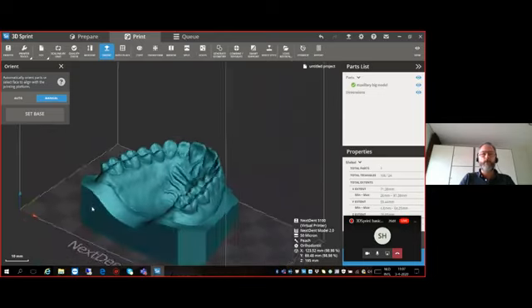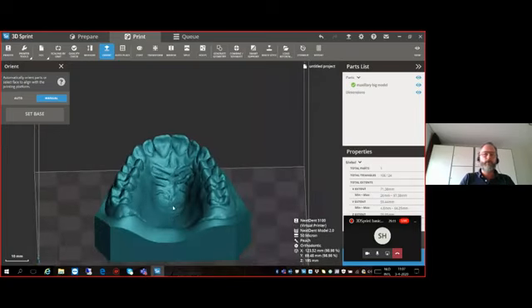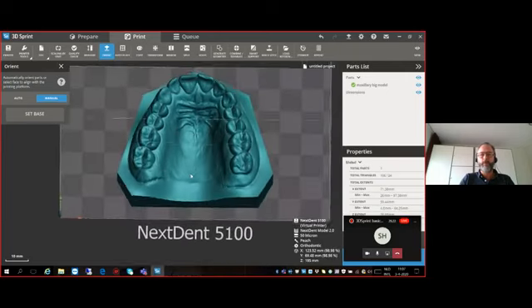The movement of the entire platform is done by holding the right mouse. And when I want to move the entire platform, I just select Shift, right mouse, and then I'm able to move the entire platform.